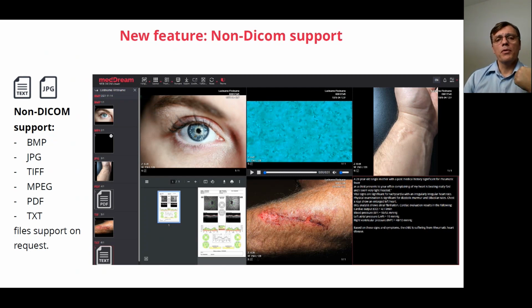First, we already created an official and public plugin for the file system. The file system plugin allows you to specify the folder from which you would like to open non-DICOM data and create the visualization of that folder's non-DICOM data.